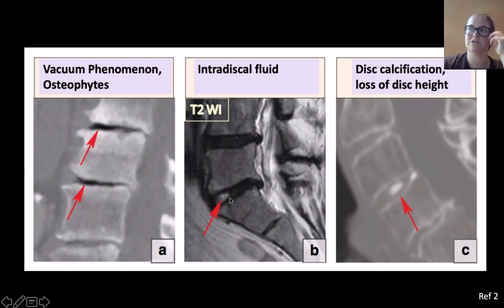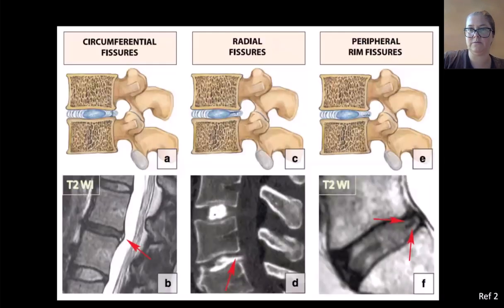It can be a little bit tricky if you've got a case of really advanced degenerative change and infection, trying to decide, okay, is that discitis or is that just degenerative change? And it can be problematic. I'm not sure if we talk about spinal infections or if that comes up in a lecture at a later point. We could always discuss it and maybe how diffusion could be helpful, things like that. Disc calcification, we don't see very often, but it's also possible.